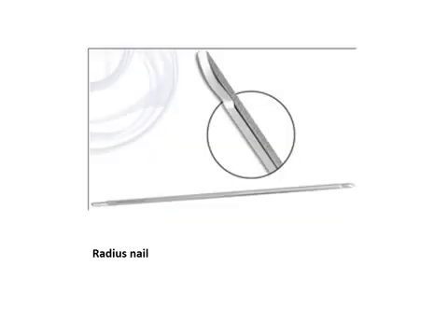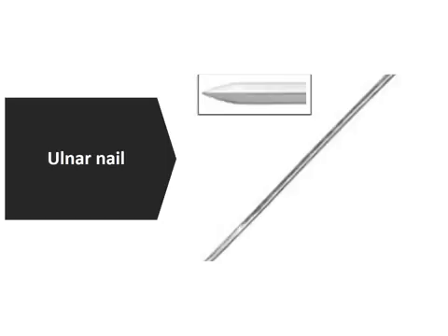Bowler stirrup. We have two nails in upper limb, one for the radius, one for the ulna. These nailings are not very commonly done nowadays because nowadays is a trend to do plating of forearm bones. But this is a bend in the radius nail which helps it to identify as compared to a straight, square ulnar nail which does not have any bend.